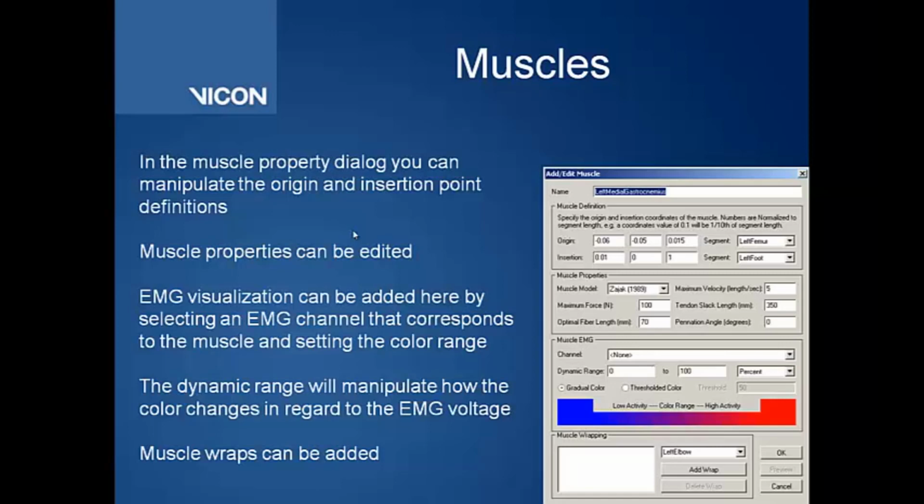It's important to note that if you are going to make these adjustments, that you realize that you're altering the model itself. And so if you make alterations to that model, then it's no longer the validated version. And so that's just something to remember going forward.